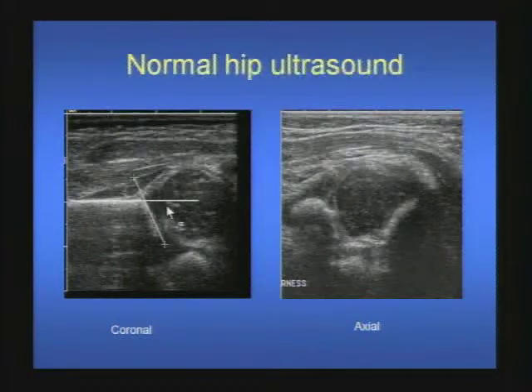However, up to 3 months of age, angles between 50 to 59 degrees are considered an immature acetabulum, and mildly dysplastic in greater than 3 months of age. The line tangential to the iliac crest is also helpful in determining the coverage of the femoral head by the acetabulum, and it should normally be more than 50%. Transverse imaging, especially in 90-degree flexion with stress maneuvers, is helpful to dynamically demonstrate the laxity or subluxation of the hip joint.